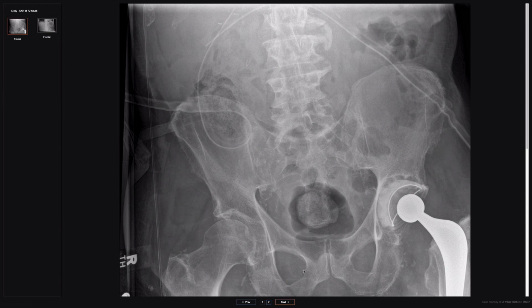One is that the gastrographin in 72 hours has made its way all the way around and left completely, including all of it passed out the large bowel. Or what I think is more likely, which is actually most of it was suctioned out by the nasogastric tube because of the ongoing vomiting that the patient was having. And in fact, nothing's gone through at all. So really, there's no more comment you can make about this.